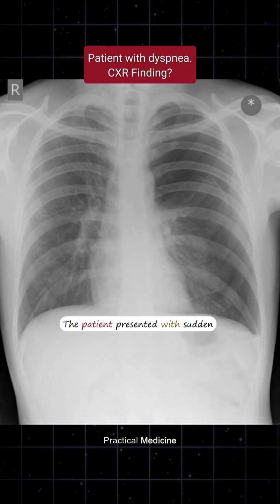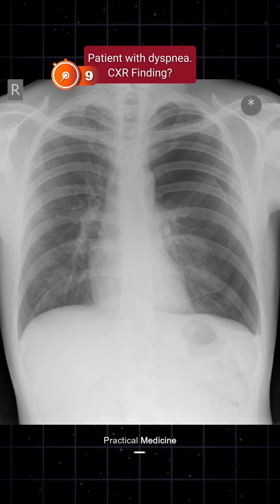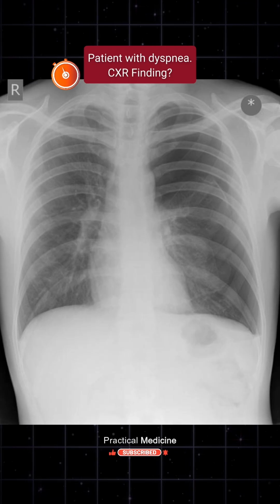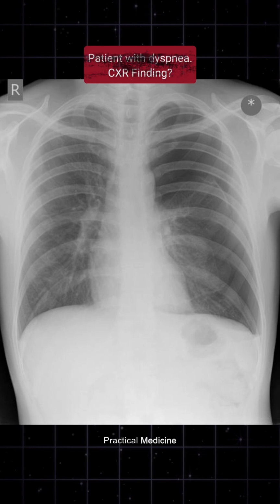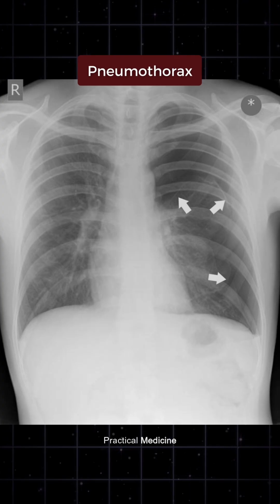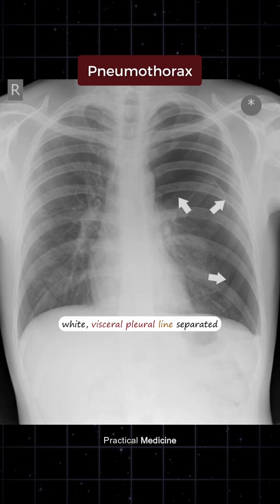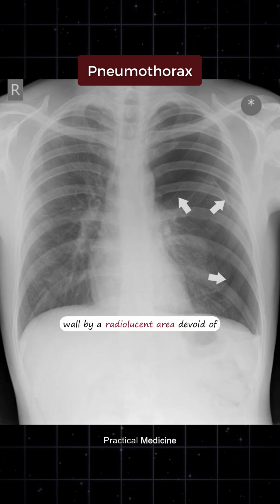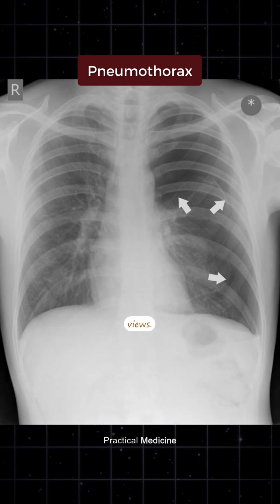The patient presented with sudden shortness of breath. What is the diagnosis? There is a left-sided pneumothorax in this chest radiograph. Pneumothorax on chest X-ray appears as a thin, white, visceral pleural line separated from the chest wall by a radiolucent area devoid of lung markings, typically at the lung apex in erect views.